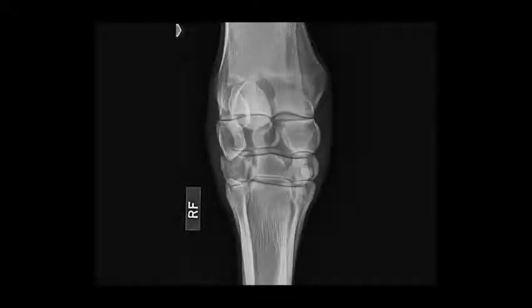We'll obtain this view, and you can see that we see the lateral and the medial surface of the carpus. So we can see the lateral surface of the radius, including the styloid process. We see the lateral surface of some of the carpal bones, and then the same holds true for the medial surface. We see the medial styloid process of the radius and the medial surface of some of the carpal bones. The accessory carpal bone is completely superimposed over the radius and proximal row of carpal bones in this view.